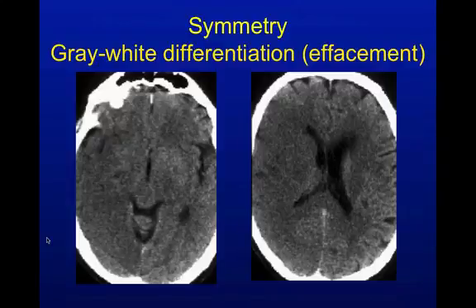More symmetry. What do you think? I'm going to give you a second just to look at that. There's brain there, yeah. It's kind of gray and fuzzy, yeah. But if you look close here, you can see there's all kinds of little lacy, fine, gray-white patterning in here. And over here, this side, that's just a big old gray blob. Over here, same thing. Big old gray blob. Whereas here, you can see nice gyri. You can see gray-white interfaces. So this side over here is abnormal. There's a tissue edema here from an ongoing infarct.